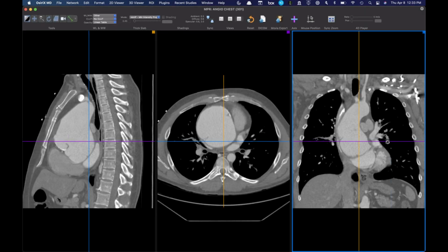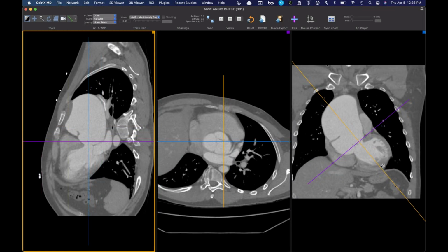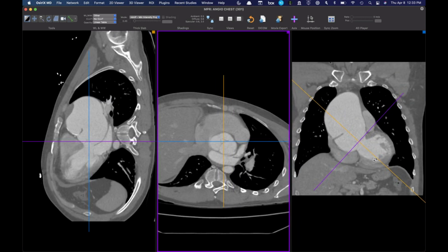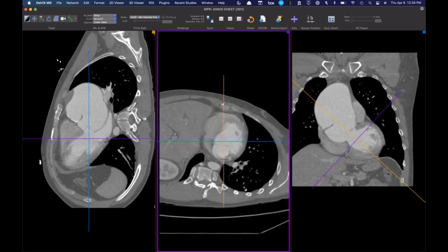No, it's a good thought. I mean, especially with his brother passing away a year ago from a type... Now it's tricuspid. But he's got regurg. I'm surprised he doesn't have more symptoms from the regurg, because you can see there's complete lack of coaptation there. His LV is a little dilated, so he probably has a significant amount of regurg.